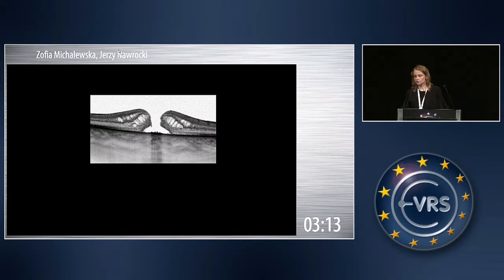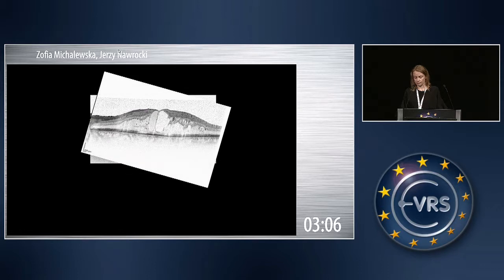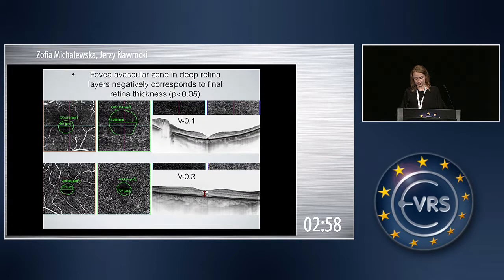Macular holes are a model disease, but all the segmentation errors or the artifacts visible there might be of special importance, for example, in diabetic or other macular edemas. So please be very careful when interpreting the images by OCT angiography.